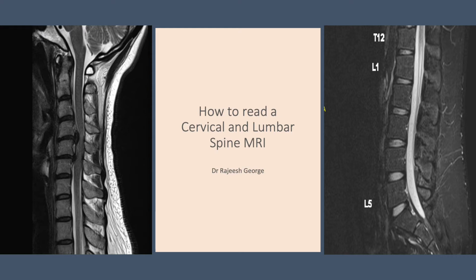Have you ever had difficulty in reading an MRI scan? This talk will help you to read an MRI in 5 easy steps. The purpose of this talk is not to go into the physics of how you do an MRI, but how to interpret it.